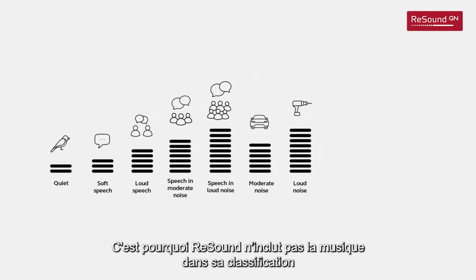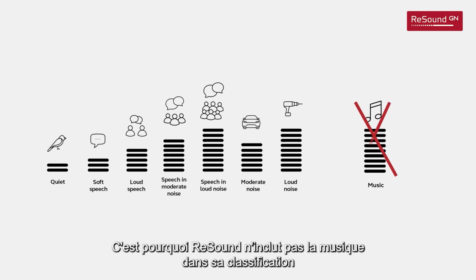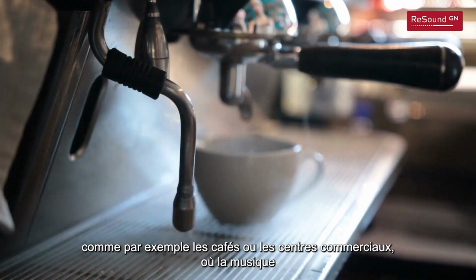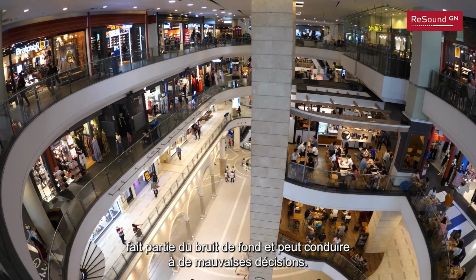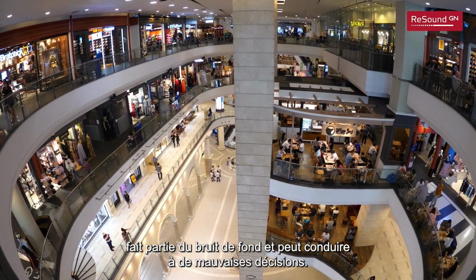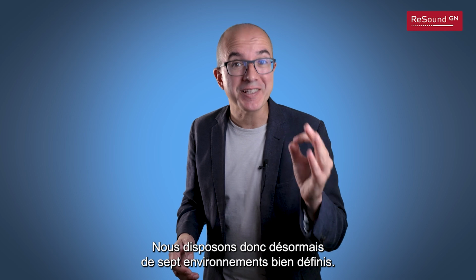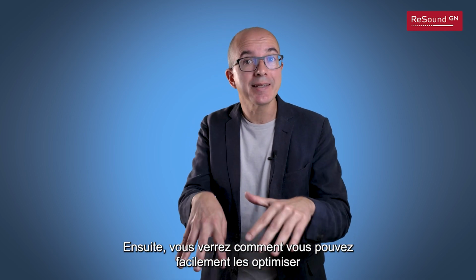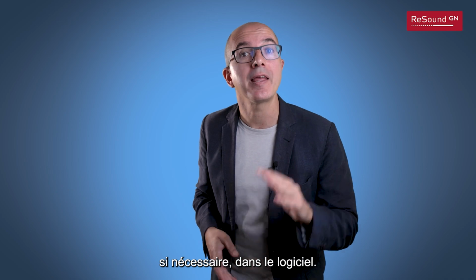This is why ReSound does not include music in our classification, because there are many places in real life, like for example cafes or shopping centers, where music is part of the background noise and can lead to the wrong decisions. So now we have 7 well-classified environments. Next, you will see how you can easily optimize them if necessary in the fitting software.